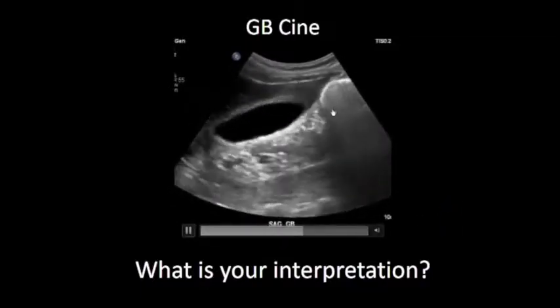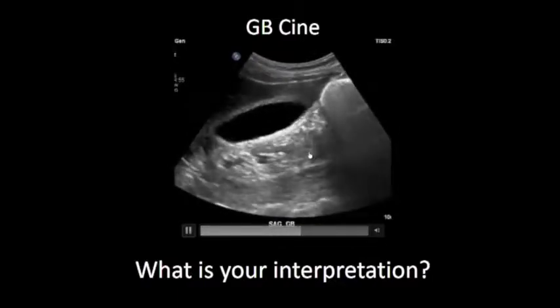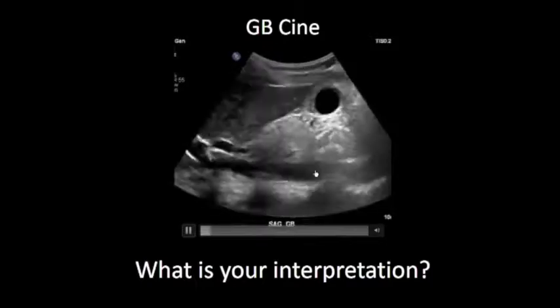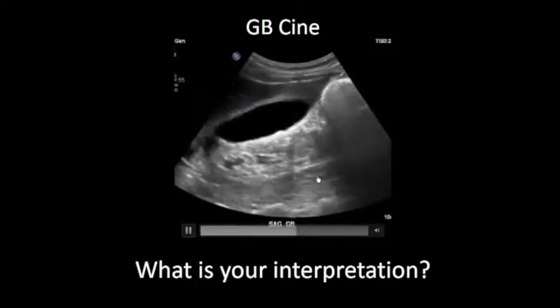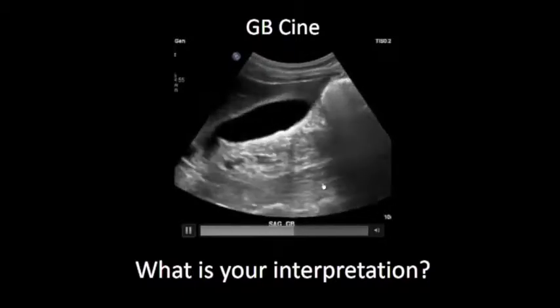You can see a little bit of fluid here. I mean, this was pretty suspicious. So what was the preliminary read that was sitting there? It said acalculous cholecystitis. So that doesn't make a lot of sense. I mean, this is not a sick patient who came. Why would this patient have acalculous cholecystitis?